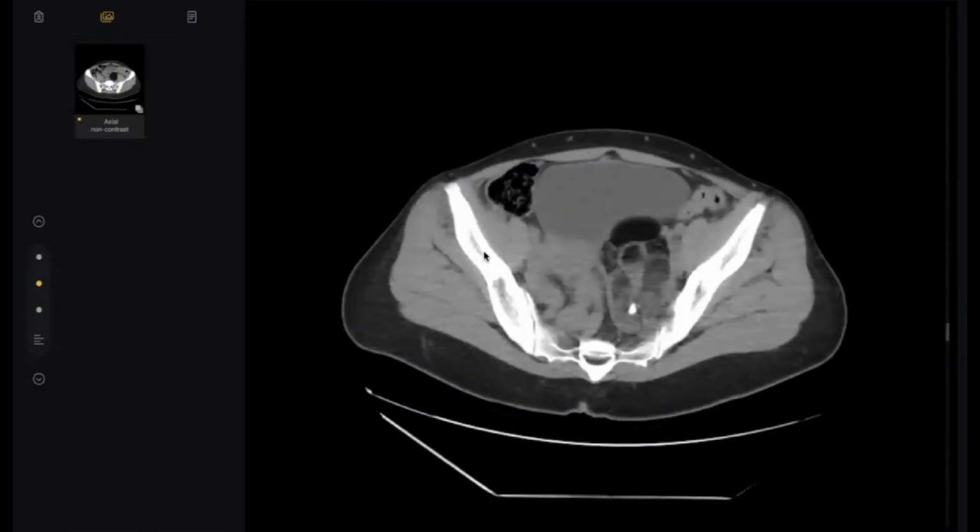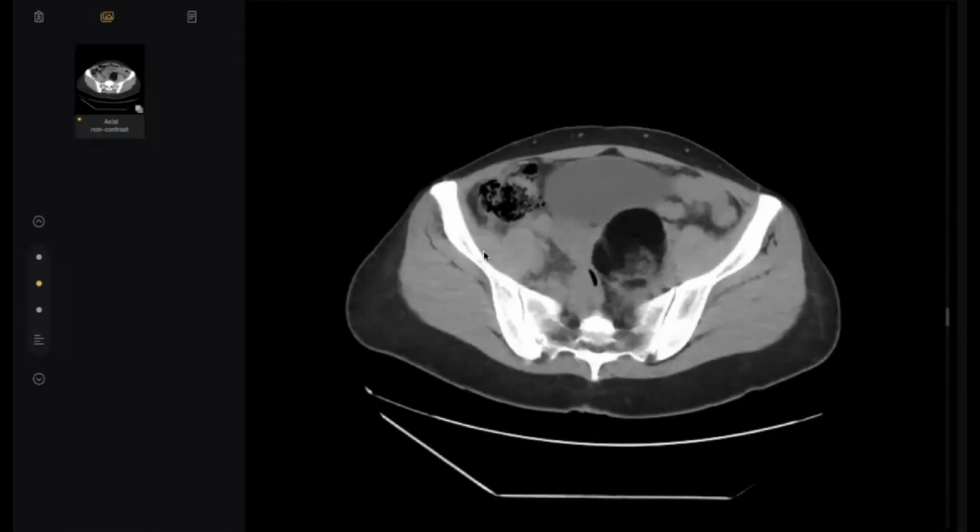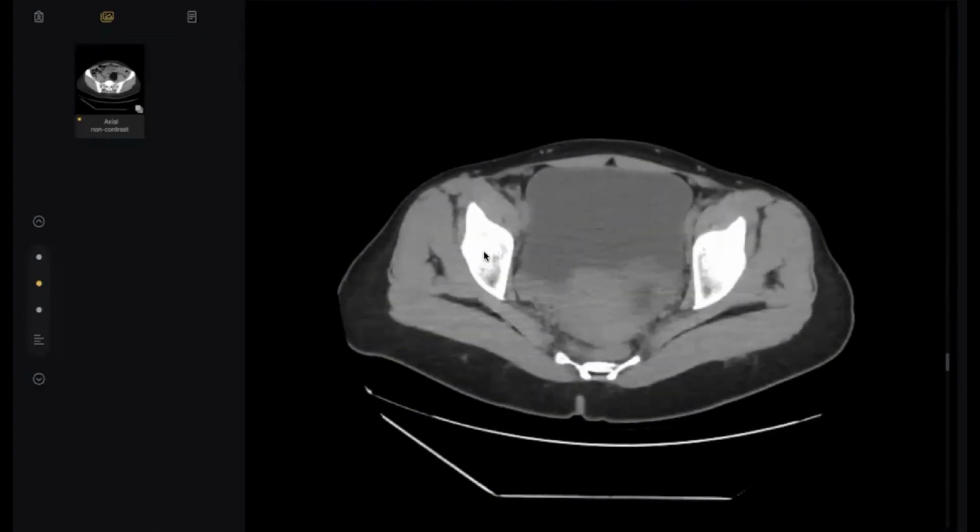Look here. Yes, it is dermoid. Fat areas and calcification are there. Where is the hemorrhage here? Nothing. Thank you so much, sir. Next candidate.